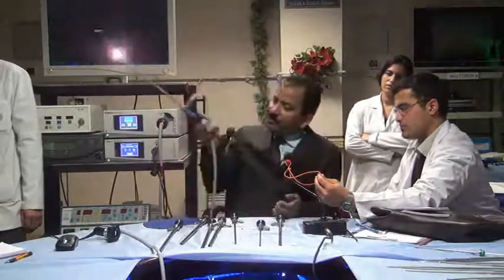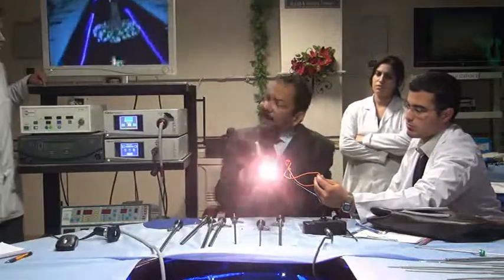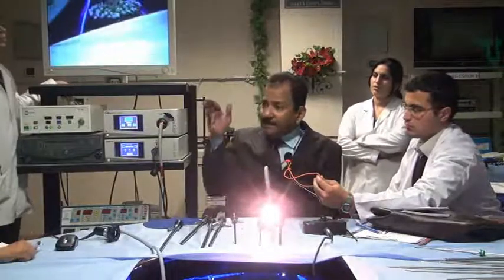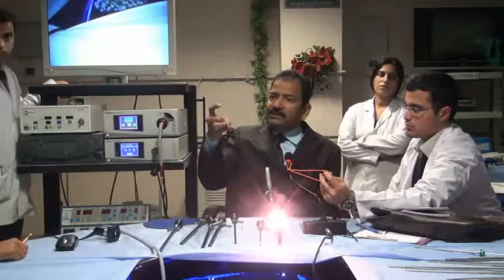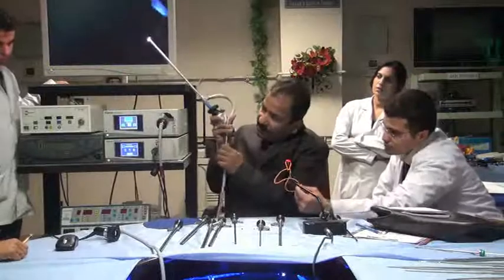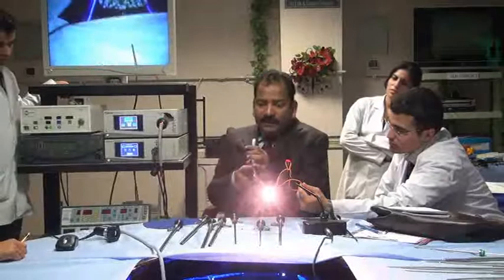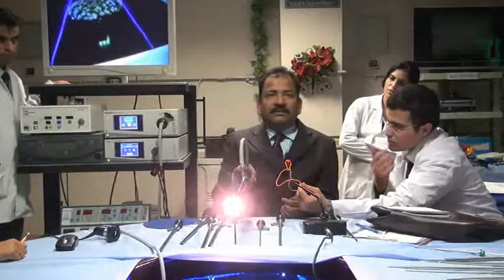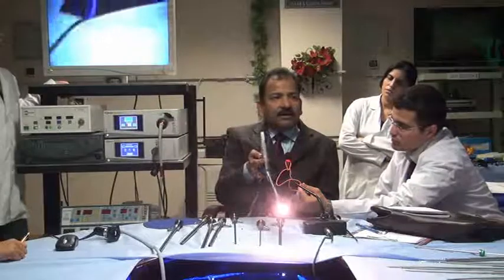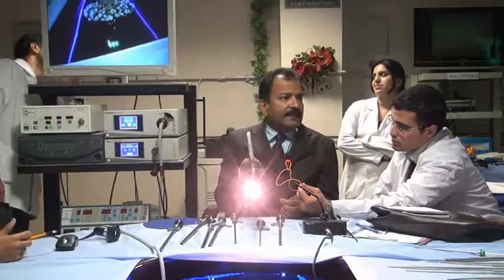Actually, this is the way to hold the telescope. This is the way, for any telescope, 30 degree or 0 degree. Why is 0 degree also important? I am coming to that point. These two fingers should go in this groove, and these two cables should be bent here, and there should be one arc made by the light cable. This is the way. The thumb should be free for buttons, and you should hold it like that.